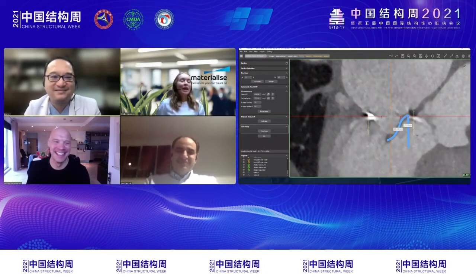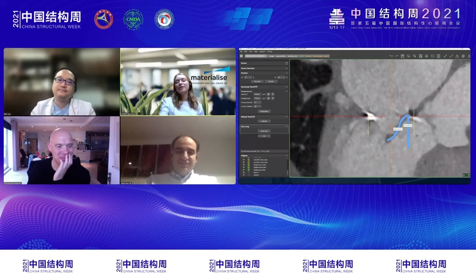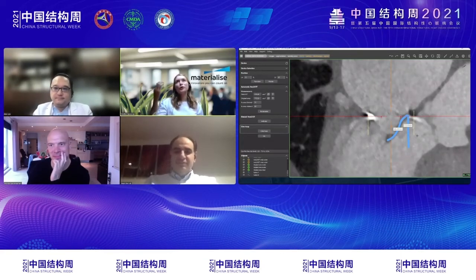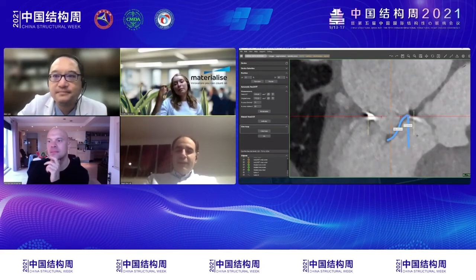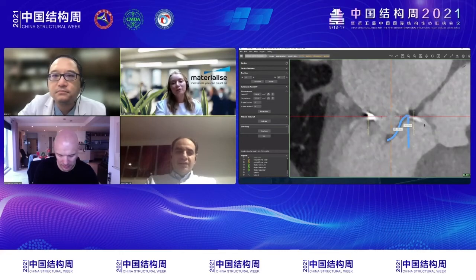Yeah, true. However, I do want to say that it does give, I think, more also for you to imagine and visualize and try to assess how it will move there. And so you could do some spline indications or something like that. But indeed, how the leaflet will be after implanting the valve is not something we can do already.